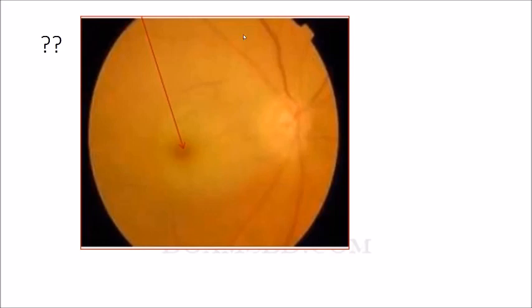Is the vessel normal? Vessel numbers are less, and these are attenuated. Dr. Saida, can you say if the disc is normal looking? Be interactive, please. Now, welcome, Dr. Rafid. You have just attended. Now, Dr. Rafid, can you see? Is the disc normal?